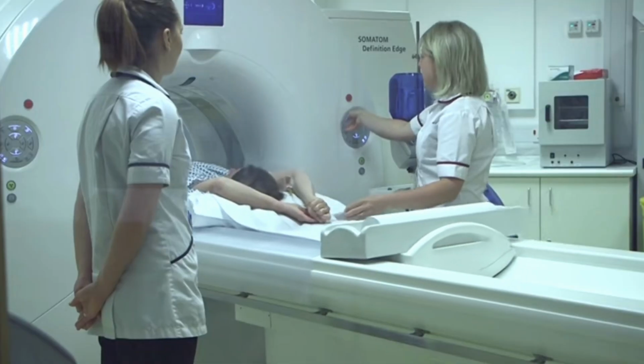helmet. For those of you who have never looked at a CT scan, let me show you how we're going to be looking at it using Mr. Melonhead as an example. When you're looking at a person, you see their eyes, their nose, their mouth, but when you're getting a CT scan, you're laying on your back, so your head is positioned like this, and it moves through the scanner front to back. So the way the CT scan gets the images, it makes slices through the head like this. So when we're going to be looking at the CT scan, imagine we're looking at cross-section slices through the head.